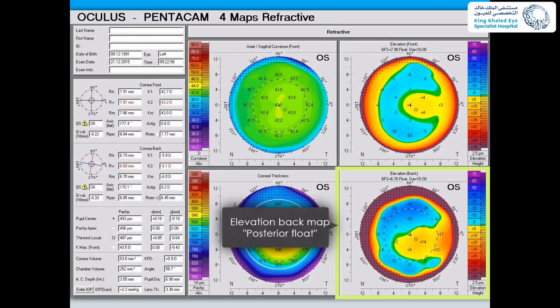But again, people are not sure how much increase they will use to call it increased, from 14 to 24 or 14 to 20. So hopefully in the future, the posterior elevation data will be normalized.